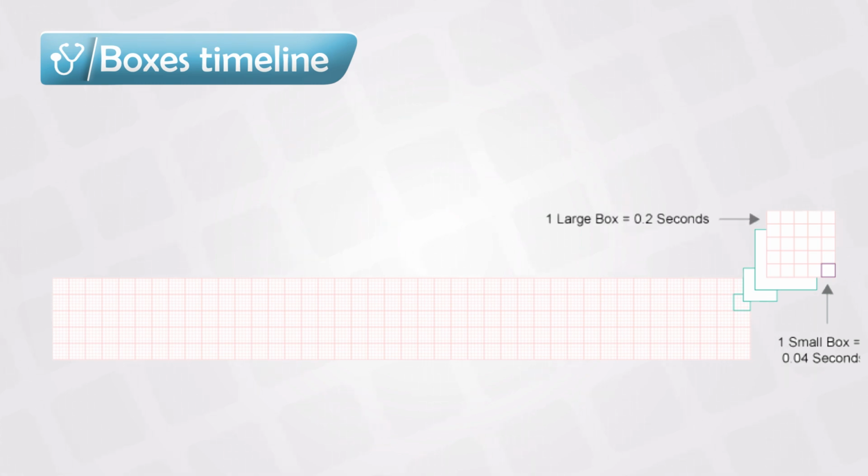When you look at an ECG, you will see a grid, mostly reddish in color, and it extends horizontally. That's why we call it an ECG strip. You don't need to worry about the very small boxes, although for the sake of information, they make up about 0.04 seconds. The bigger ones are more important, and they make 0.2 seconds. So each 5 of these boxes makes up 1 second. And this is very important to know.